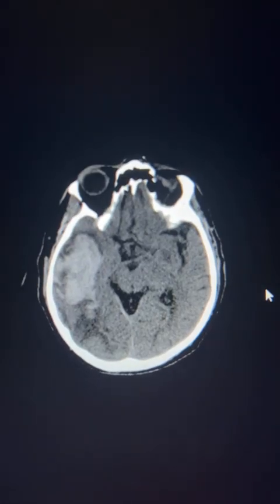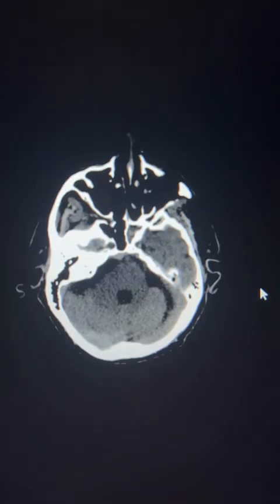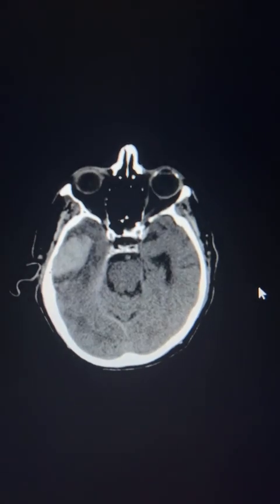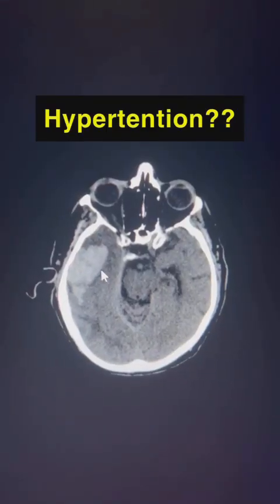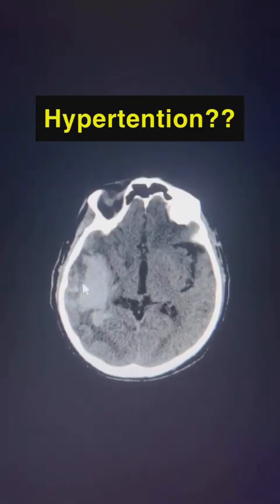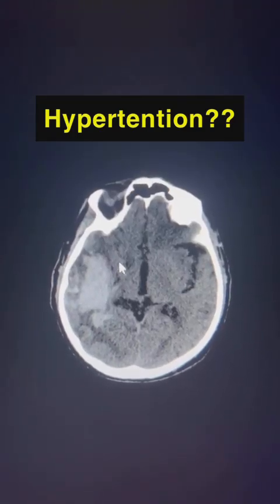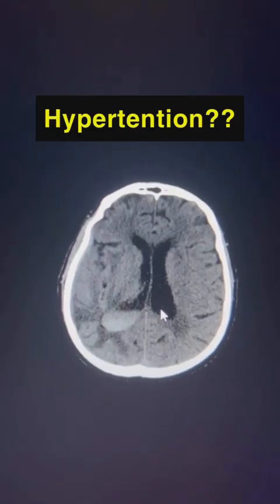This is an elderly patient who presented with left-sided weakness. The abnormality is obviously seen here as a large area of intraparenchymal hemorrhage exerting mass effect with extension into the ventricular system.